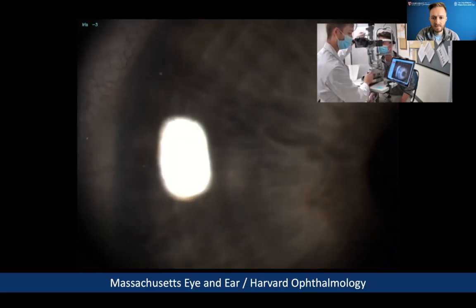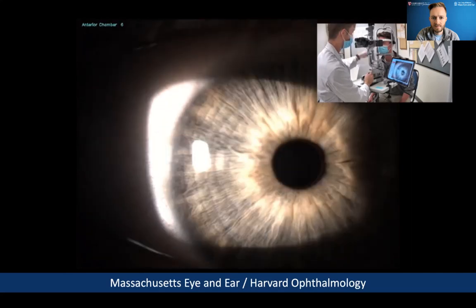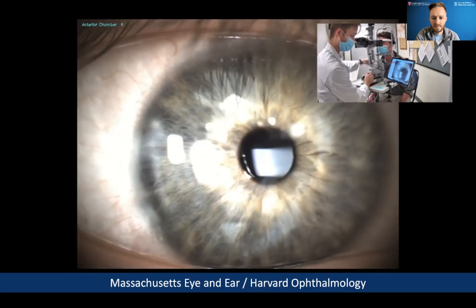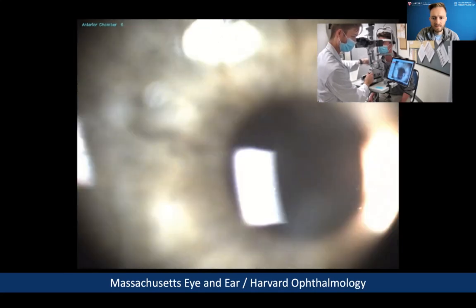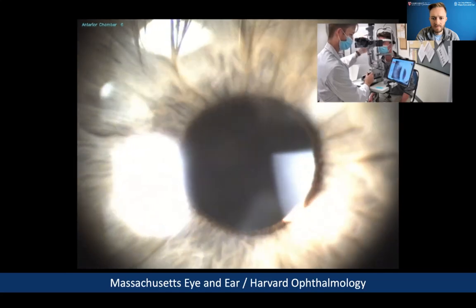We can zoom in just as we normally would on a slit lamp to look at fine detail if we'd like. Pressing the anterior chamber button, we can make a small, thin beam, turn it to the side, and highlight the fluid in the front of the eye. If there was bleeding or inflammation, we would see the cells floating around at that time. But luckily, our model has no inflammation or bleeding inside of the eye.